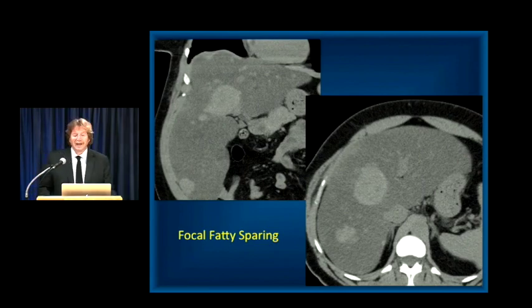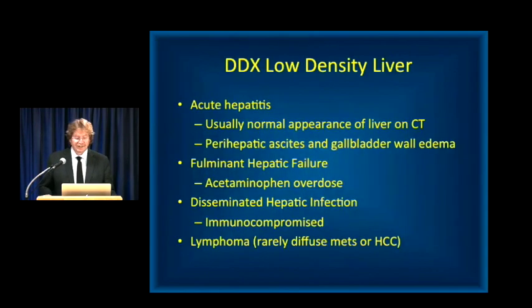So you need to be very careful. I think at times it can be tricky. Fatty infiltration does make our job a little bit more difficult. There's at times the tendency to overcall the presence of metastasis, but I think when you look for the full sequence of images, it's usually not that difficult. Obviously, we're typically not looking for metastasis on a non-contrast CT scan.